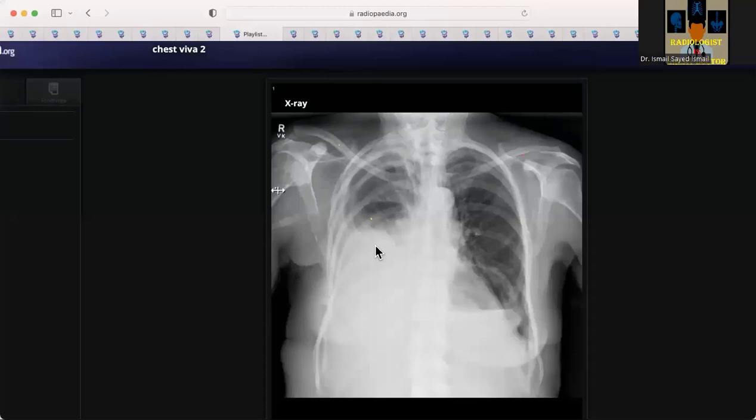I would say this is a patient with a previous breast cancer, with a history of surgical operation, and surgical clips are noted. Seen is a recurrent mass lesion associated with elevation of the right hemidiaphragm, pleural effusion, and a lytic lesion in the right scapula. Yes, that's right. And she has some sclerotic mets here, so she has a lot of findings. So I'd call it a malignant pleural effusion with bone metastasis, both lytic and sclerotic, secondary to a previous breast malignancy.